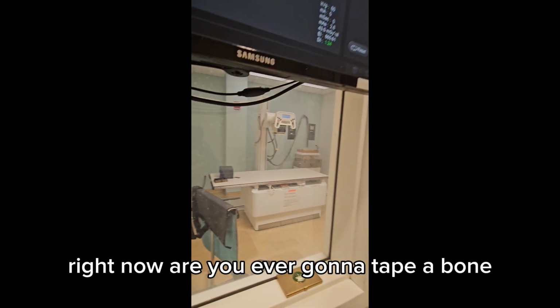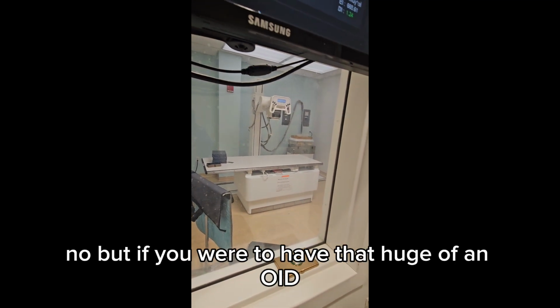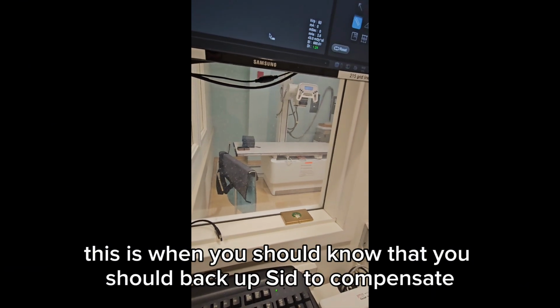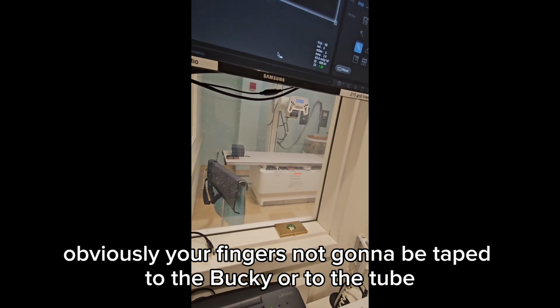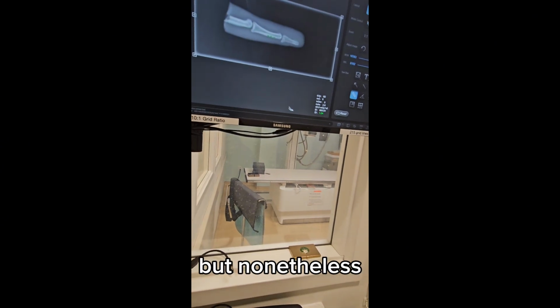Now, are you ever going to tape a bone halfway through the x-ray tube in the table? No. But if you were to have that huge of an OID, this is when you should know that you should back up SID to compensate, okay? Obviously, your finger's not going to be taped to the bucky or to the tube, but nonetheless.